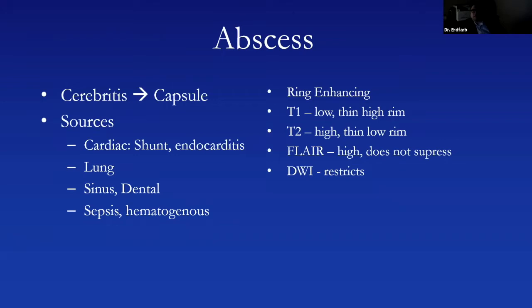The important thing to remember about a lot of these parasitic infections in the brain is in the early stages where they're just happy to live in the brain, you'll have what looks like a cystic lesion without surrounding edema, right? Until the parasite, let's say, dies and the capsule starts to leak. You might not have any edema or any symptoms, and oftentimes we'll diagnose such disease after a few years when whatever lived inside the cyst dies, starts to leak into the brain. All of a sudden you get the headaches, you get the mass effect, you get this inflammatory response.